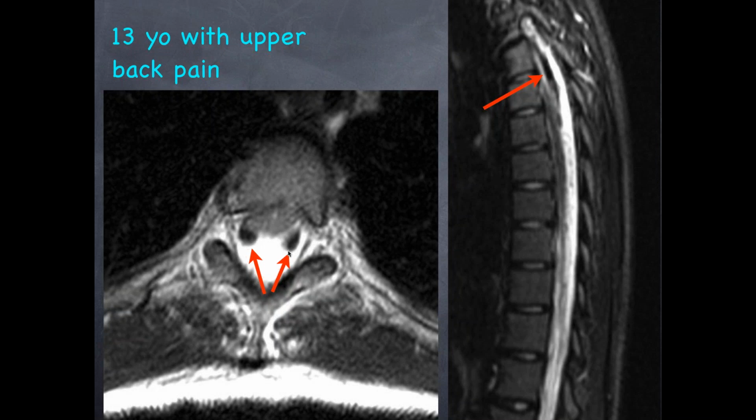And we saw these, and so we thought, first thing was, oh my gosh, we're missing all these AVMs or malformation and so forth, because it's so sharply defined. We kind of thought, well, if it's flow voids, it's not going to be sharply defined like this. But these are flow voids. This is normal CSF flow. And we then went through a lot of different techniques to try to minimize it.